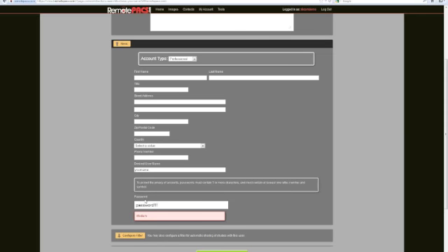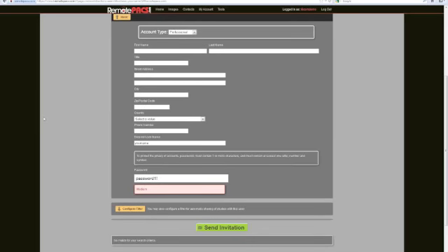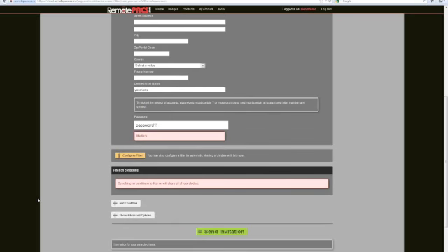So once you do this, please note what the username and the password is, because you'll need to share it with that user that you've given access to. Okay, so there's one more step, because what we want to do, if this particular physician, we want to share based on a rule, automatically. Every time, let's say we're an imaging center and we have a referring physician, we want to share every one of their patients with them automatically. We can configure that here before they even log in.